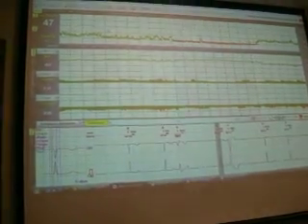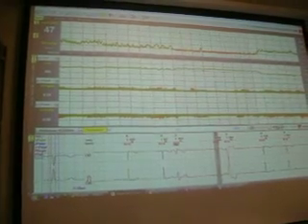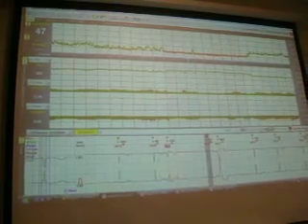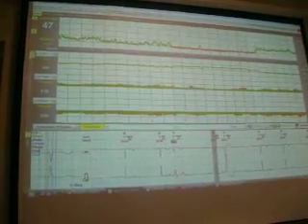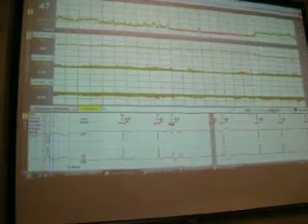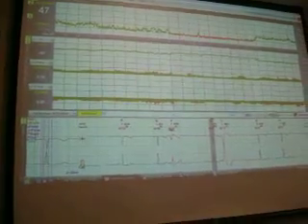We use color-coded graphics. You can see in the heart rate, it is colored red. It means that there is a radical change on this picture. And you can see some red parts on the ST level graph. It means that the ST value is higher or lower than a certain limit.